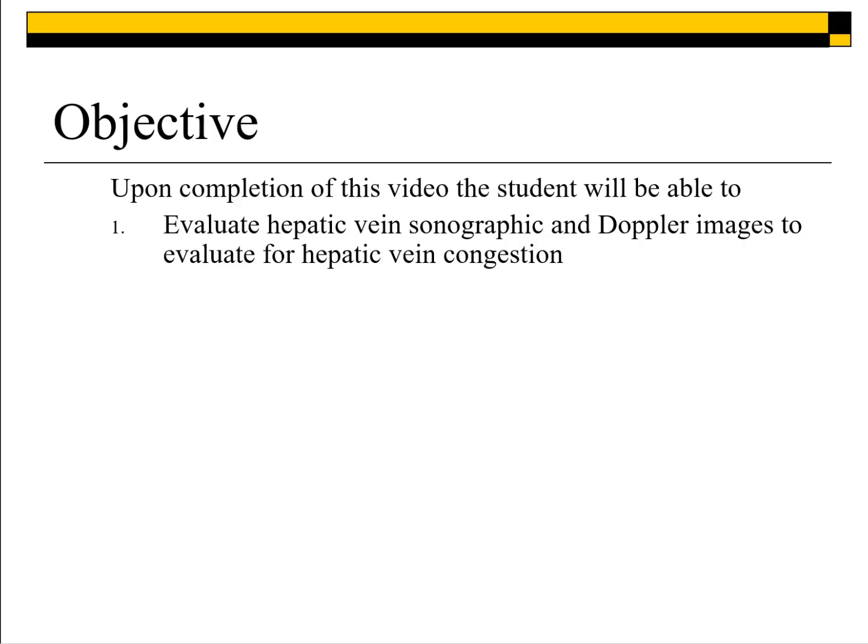The objective of this short review is for you to be able to look at hepatic vein waveforms and images of the hepatic veins and be able to recognize congestion and determine what pathologies are causing that hepatic vein congestion.